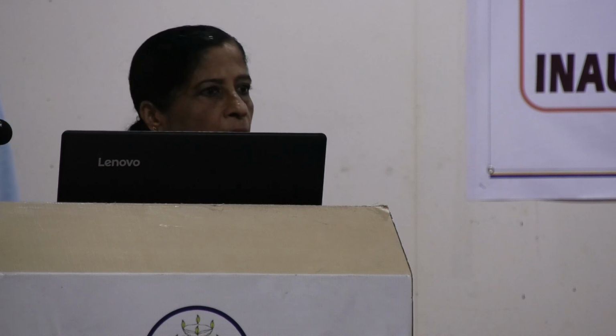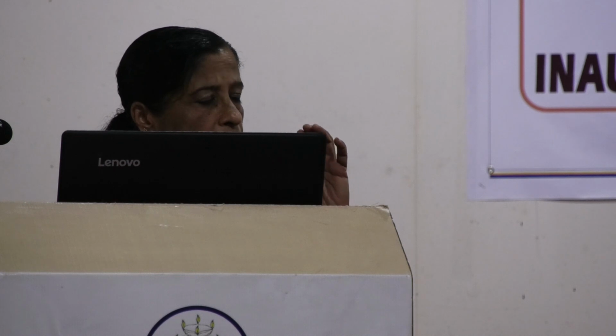Pulmonary embolism. There are some findings in pulmonary embolism in plain X-rays. A few of them I can tell: the pulmonary arteries will be enlarged. Another thing you look for in the field evaluation, where I said divide it into three, is that the lung will appear more radiolucent, more dark, because the blood supply will be less.